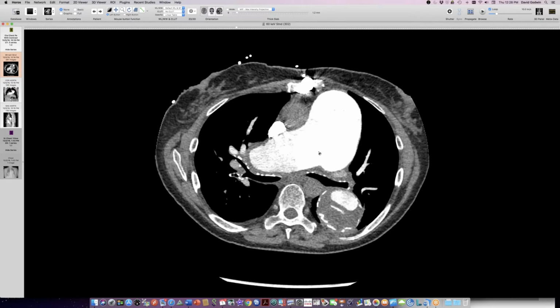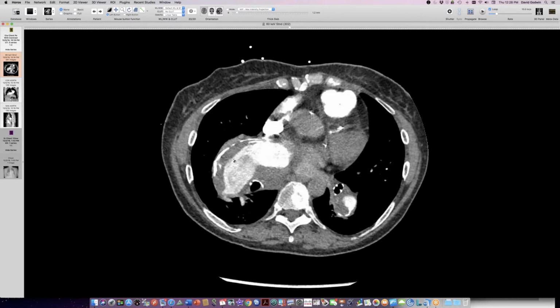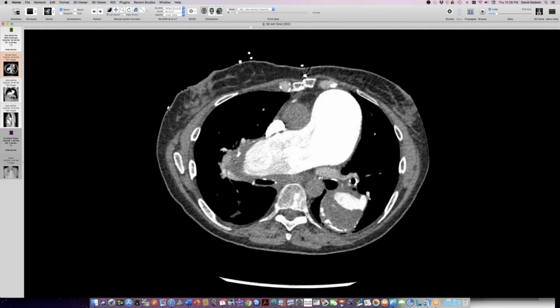Massive pulmonary artery enlargement, lots of thrombus in these pulmonary arteries. It's hard to know in this setting whether this is recurrent embolic disease or whether it's just in situ thrombosis, given how big these arteries are and how sluggish the flow is. She also has left heart disease, and she actually presented with myocardial infarction before this study.